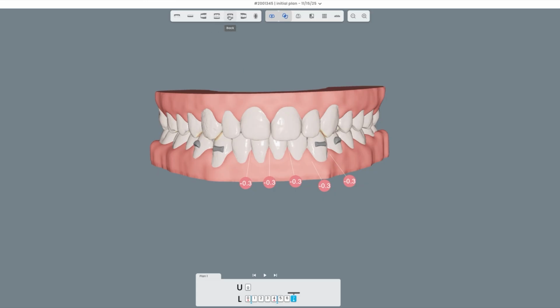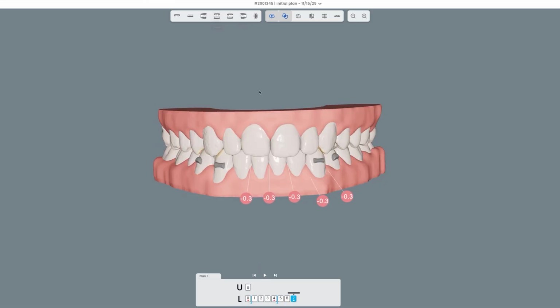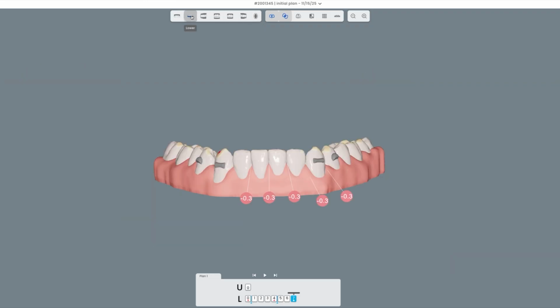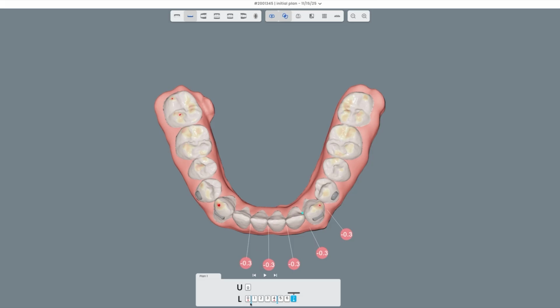We also do the same view from the back wall, kind of get an idea of how things are moving. And then we're going to check the front. Looking good. Then we do the side views. And the other side. Looks good. We're going to now focus on the mandibular anterior, which again was the patient's chief complaint in there. So we're going to back up here a little bit.